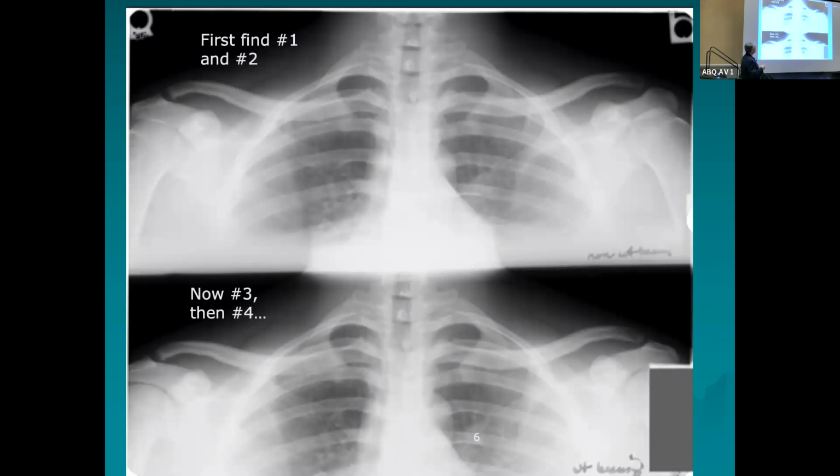So looking at this one, you can see the C right here, on the left side. You find 1, work your way up here to the top to find number 2. And here is number 2, okay? So find 1, it's the C.